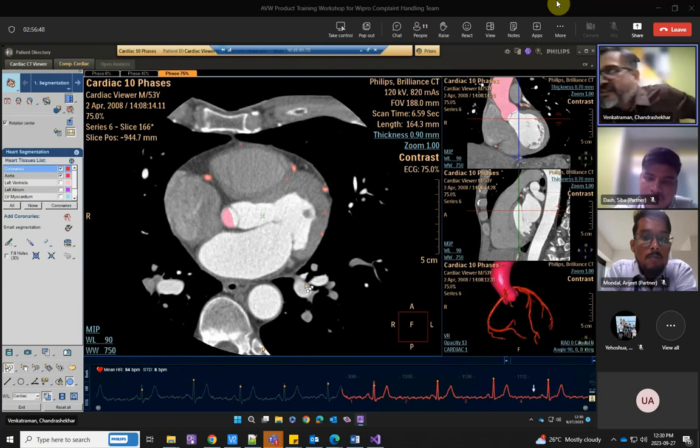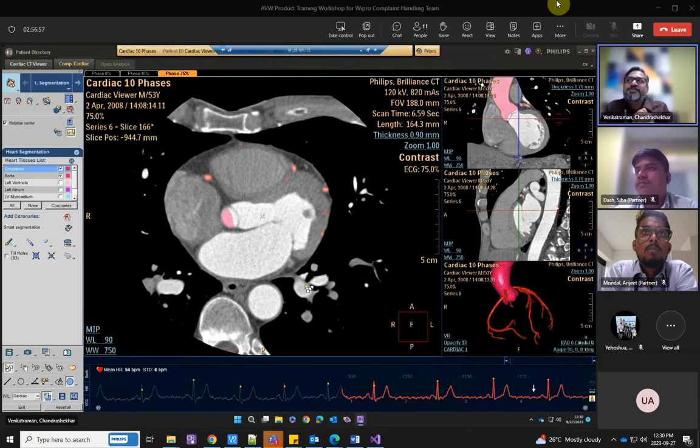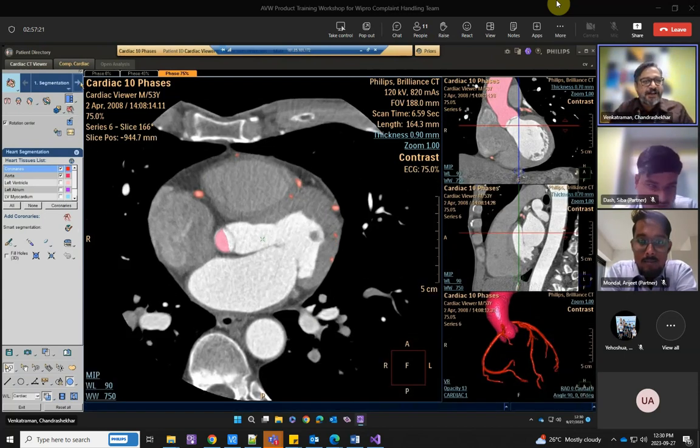Sometimes, because these phase labels are filled in while the acquisition is going on, chances are that either the scanner is not able to recognize, or the radiologist or the technician couldn't recognize the phase correctly, so they can rectify that also. They can later on relabel it or change the icon. But most of the time, of course, they are experts, so we cannot complain. Okay, next stage.